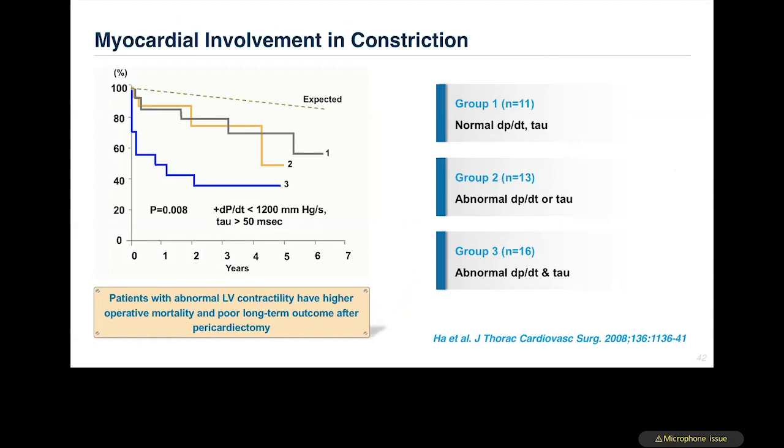And you can see here that patients who have evidence of myocardial dysfunction, even in the presence of constrictive pericarditis, this can be extremely challenging, particularly the presence of secondary causes of constriction, like cardiac surgery or previous CABG, may create a mixed picture or mixed disease. So radiation is another example. In these situations, you have to use multiple tools, multimodality strain, to understand what is the extent of myocardial disease in a patient who looks like having constrictive pericarditis.